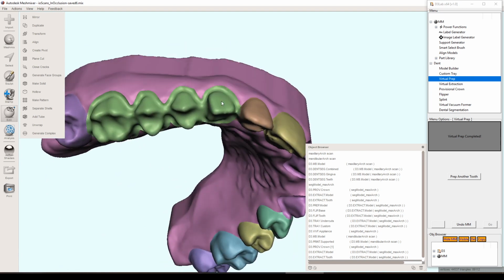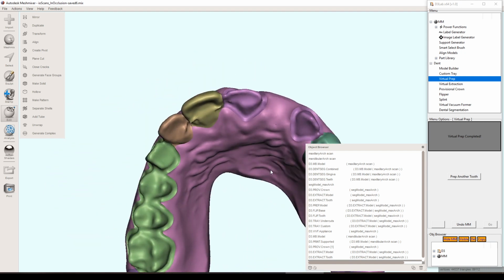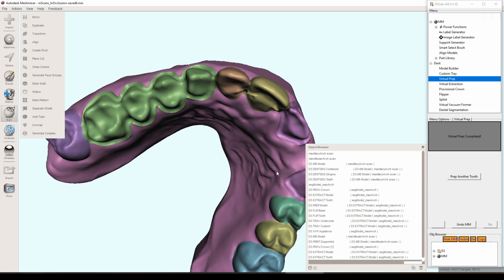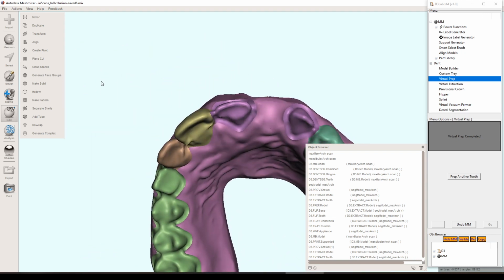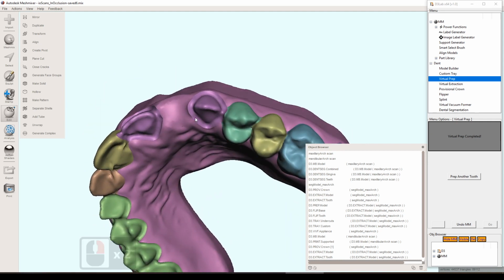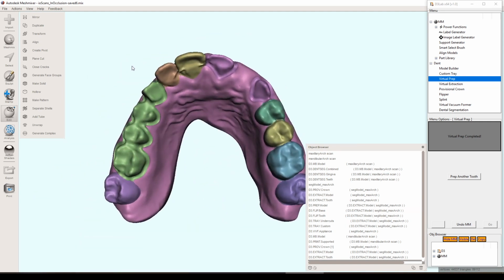I guess you could use this also for a reduction guide to make sure you're keeping things in the proper reduction. It only reduces things exactly by whatever distance you give it. So as far as undercuts and things like that go, it's never going to touch that. It's literally just taking whatever value you give it, that much off from the top topology. But it's cool. And there you go.